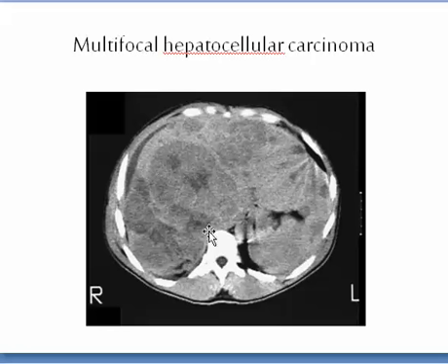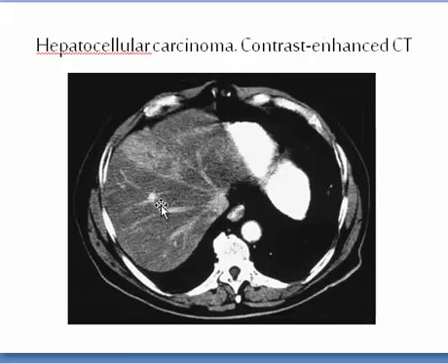Multifocal lesions of the liver, query deposits, query multifocal hepatic carcinoma, area of abnormal enhancement on CT in a fatty liver. This fatty liver with an area of abnormal enhancement in the arterial phase should be considered malignant till proved otherwise. The margins are ill-defined.